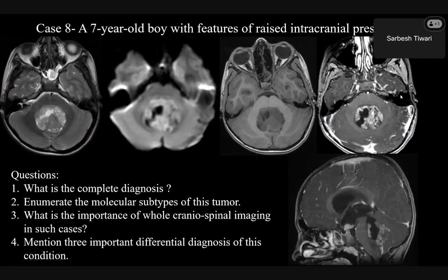Very good. So in this case, you have CSF dissemination. You can see what is this area? This is a suprasellar cistern. You have these metastatic deposits over here. You can see this is leptomeningeal enhancement also. So there is CSF spread in this particular patient. Whenever you are seeing drop mets, excellent. Whenever you are seeing a patient with medulloblastoma, make it a point that you see all the cisternal spaces and all the sulcal spaces, do acquire a post-contrast FLAIR, and always screen the spine, so that you can see the drop metastasis and you don't miss it.